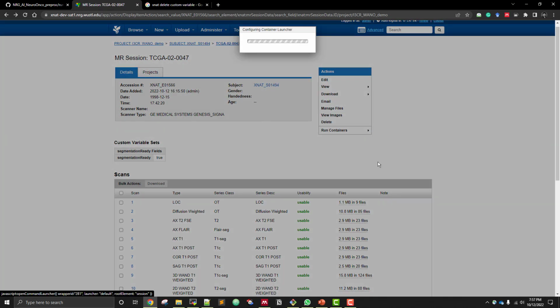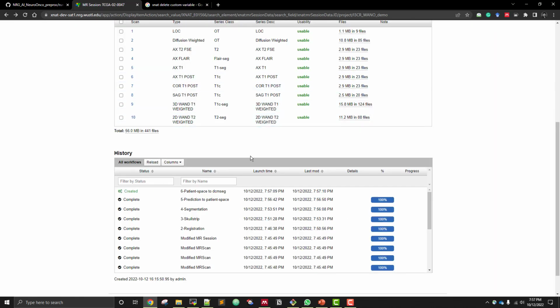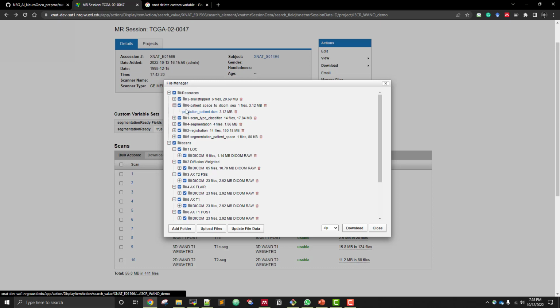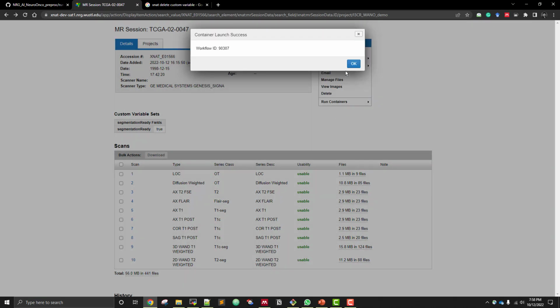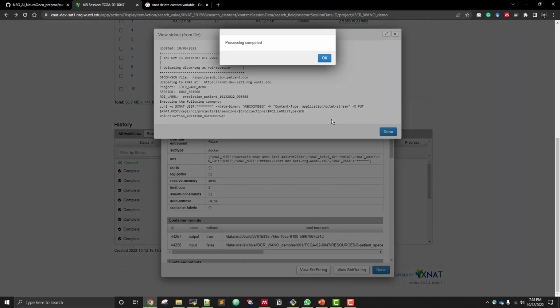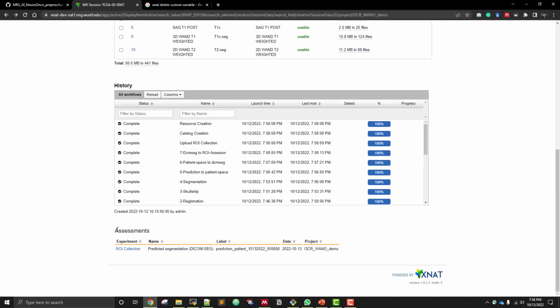And with that I move on to the patient space to DICOM-SEG format, where I basically take the NIfTI file and convert it into DICOM segmentation object format. Now this is also done, and then the final step, which is a step required only for XNAT, is where I take this patient space prediction in DICOM-SEG format and I convert it into an ROI assessor, and I see that this DICOM-SEG to ROI assessor is running. And then once it's done, this DICOM segmentation object will be uploaded as an XNAT assessor. That will help me to visualize this segmentation in the XNAT-OHIF viewer.